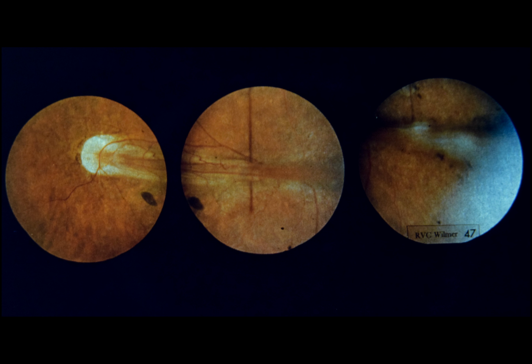On the left, note marked dragging of vessels across the temporal border of disc and loss of arcuate pattern of temporal vessels. In center photograph, just temporal to the macula, note traction detachment extending toward the temporal periphery. In right photograph, note large elevated retinal detachment in temporal periphery. Comment. This patient illustrates the asymmetric findings that are frequently noted in cicatricial retrolental fibroplasia and also provides an example of the increased incidence of RLF in twins.